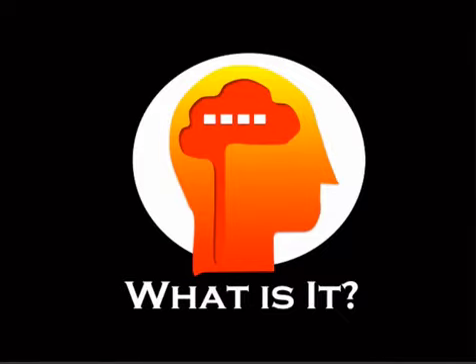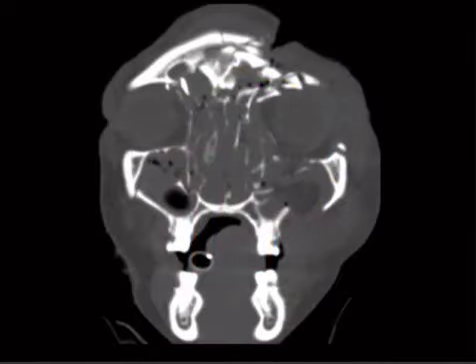All right, moving on. This guy here, that's a face only a mother could love. He's had a bad face smash, and the question would be, what kind of Lefort fracture does he have? Now, Lefort was developed by some medieval guy throwing skulls off a castle wall or hitting them with clubs. Most trauma today is from car wrecks, right? So it's a different mechanism than getting hit with a club or having your head thrown off a castle wall. So it's medieval, it's outdated, it's a stupid classification system, and as a result will likely end up on your test, the quote test of the future.